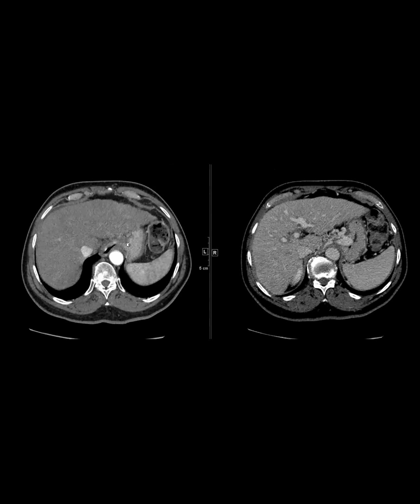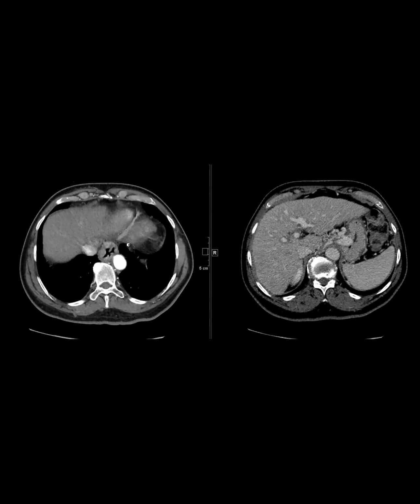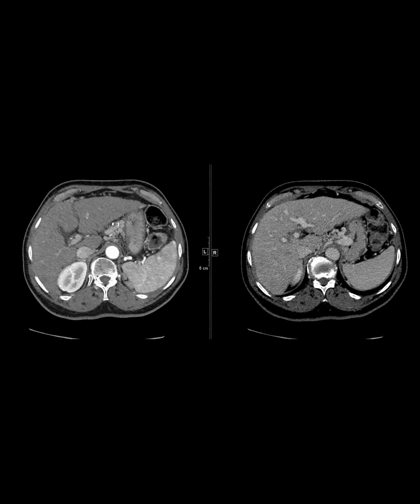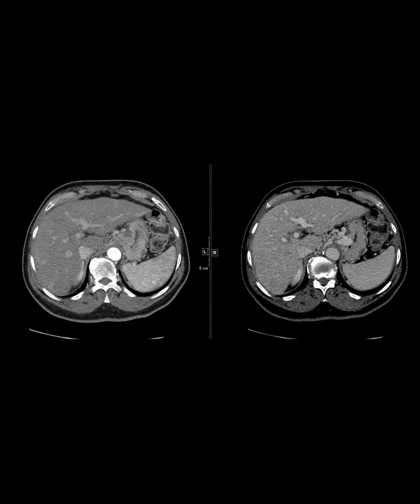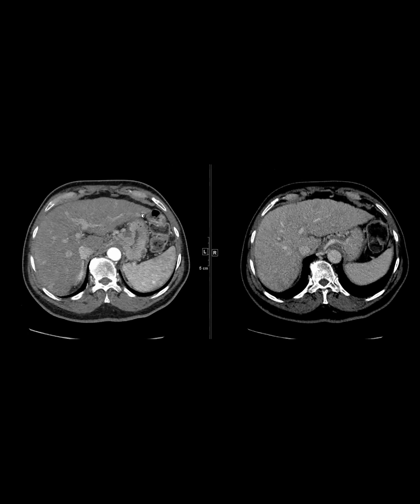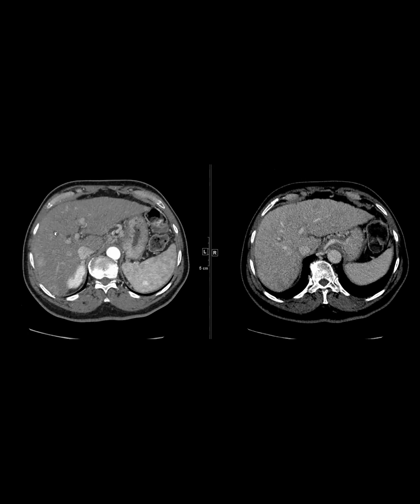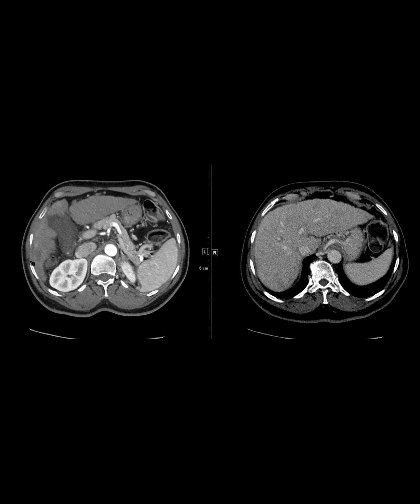So for OPTN HCCs, if you have a 10 to 19 millimeter lesion, it has to have arterial phase hyperenhancement, washout, and a capsule. And so these, based on OPTN, do not meet criteria for HCC. So based on OPTN, this is stage T0. This was treated.